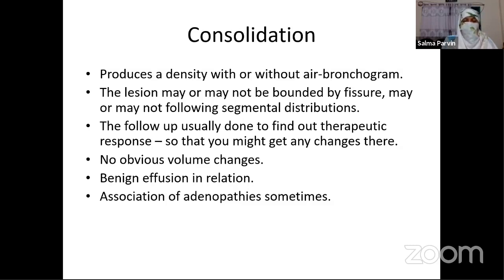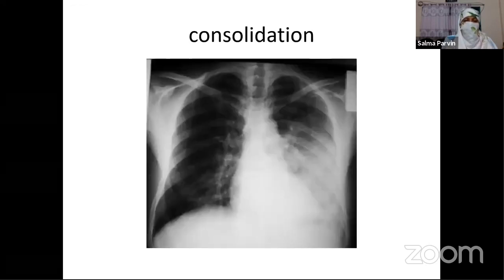And follow-up will show changes as part of therapeutic response. And you see, this is a consolidation seen in the left lung field. Whether this is a consolidation or not, you have to decide. The first thing is that there are bronchovascular markings partially seen in the lesion.